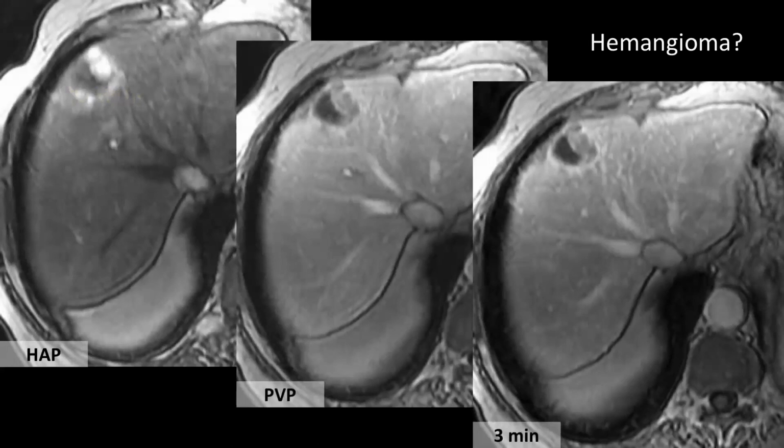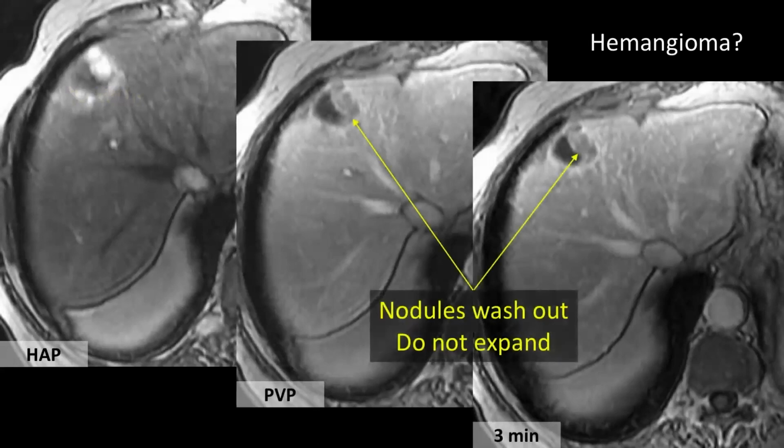This particular patient had cirrhosis, and so now you know in cirrhosis, a nodule that contains multiple inner nodules, that's a mosaic appearance, so this is a cancer, and the most common cancer in cirrhosis is HCC, so this is an HCC.